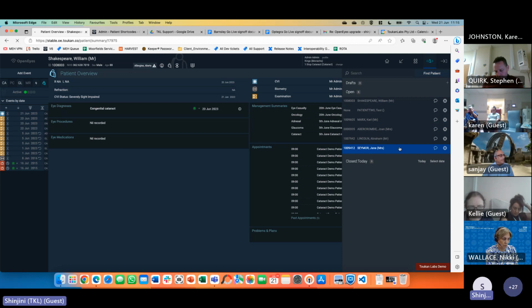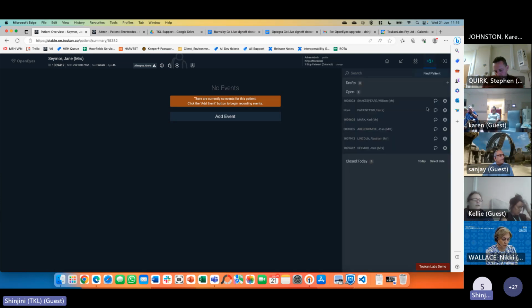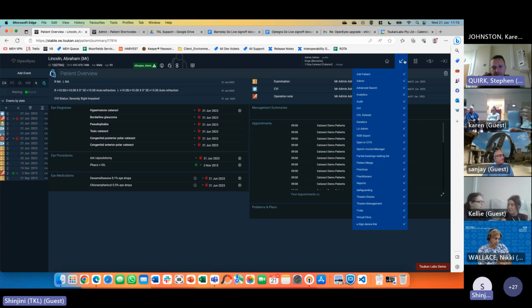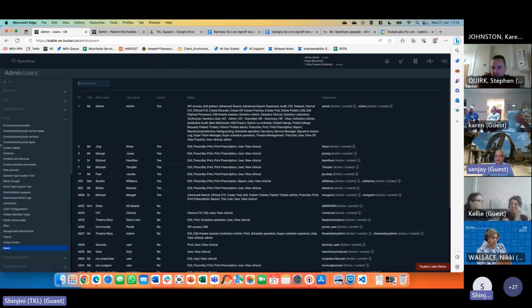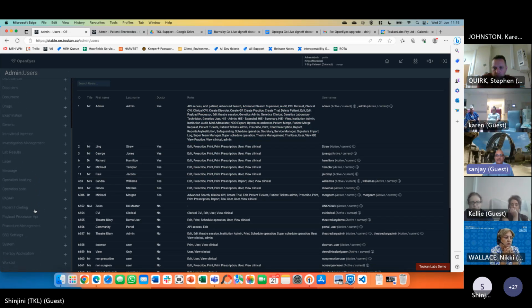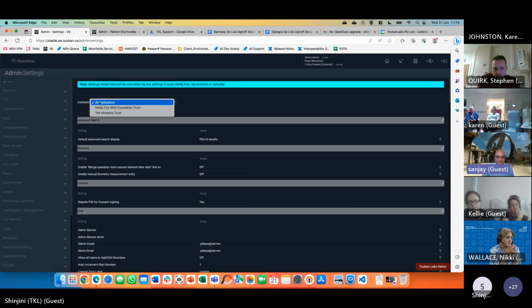I think somebody else has also disabled it. There is a way to make draft events and continue on the draft events. I can show that to you. In another session, definitely in my play domain, it's not switched on. I think somebody else is using it, probably, yes, and this is the issue. This is a generic environment that we use for customers, so somebody else is probably testing something on here. I switched it off.